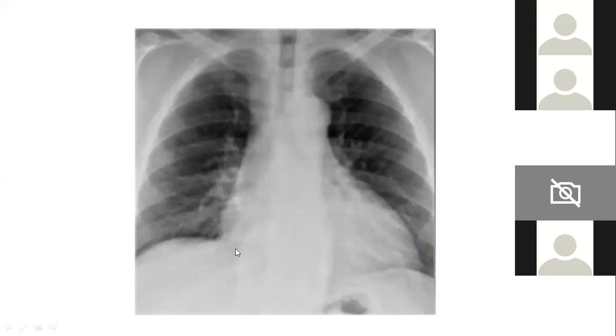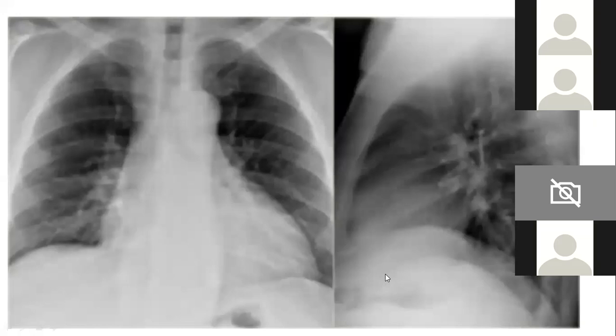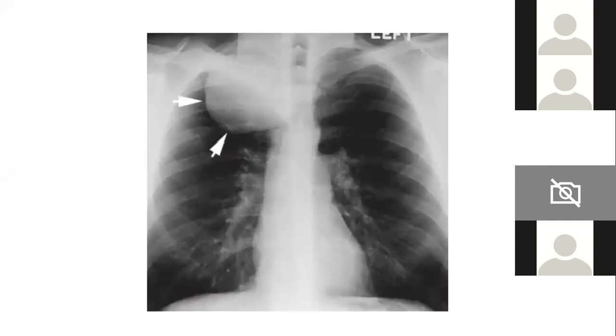So there can be bilateral paravertebral abscesses, as was in this case, correct? There can be extramedullary hematopoiesis, and very similar looking, achalasia can be there. So bilateral lesions, again, differentials we are supposed to know, okay? On the lateral view, we can make out that the disc is involved. So it was a case of spondylodiscitis with bilateral paravertebral abscesses. Now, what is this?